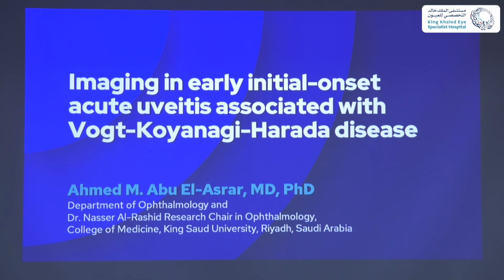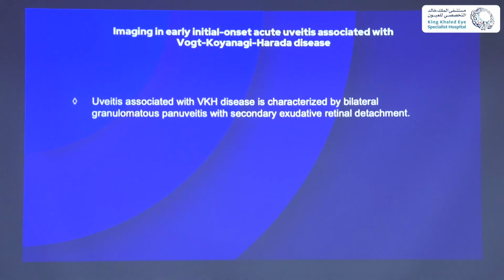And most likely, these cases are misdiagnosed as central serous chorioretinopathy or pseudotumor cerebri, with unnecessary referrals. And this, of course, will result in delaying treatment. So imaging helps inexperienced ophthalmologists to make an early diagnosis, and also allows us to better understand the pathophysiology of the disease and how to avoid complications.